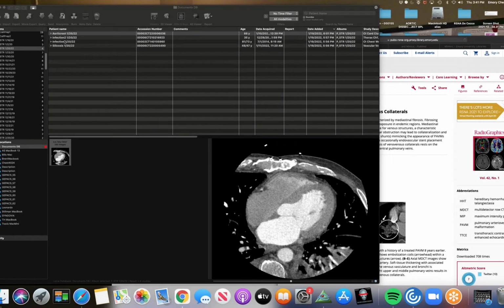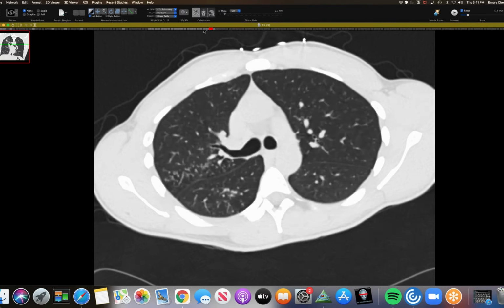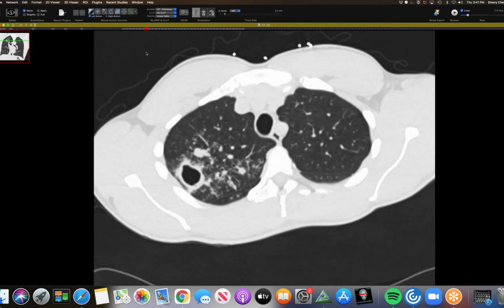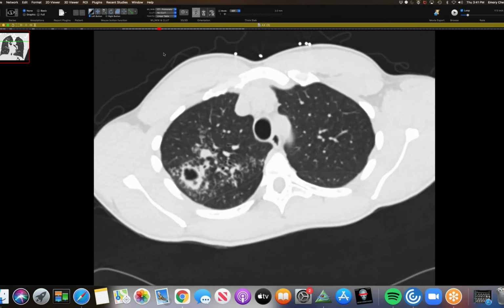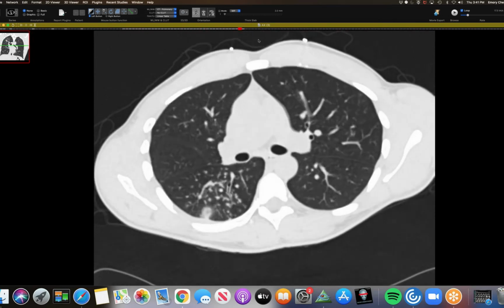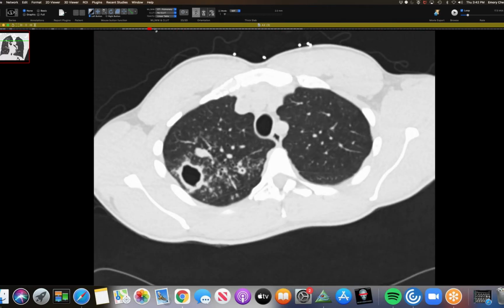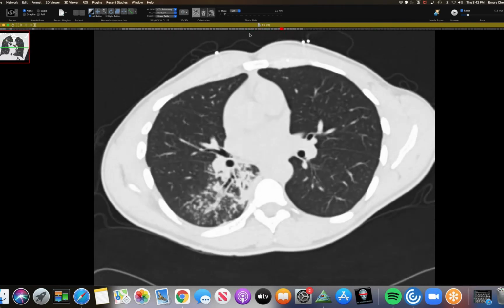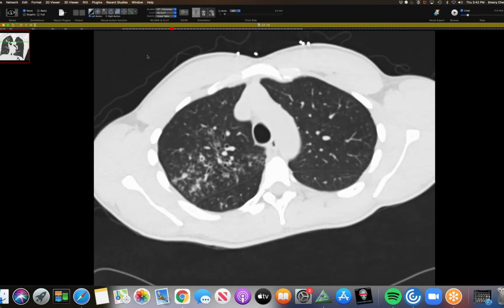So this one's good for students and junior residents. It's a patient in their mid-30s with shortness of breath, productive cough, weakness, and weight loss. Imaging shows right upper lobe centrilobular nodules and cavitation. ID was consulted and did a full workup. HIV was negative, but the sputum cultures are positive for tuberculosis.